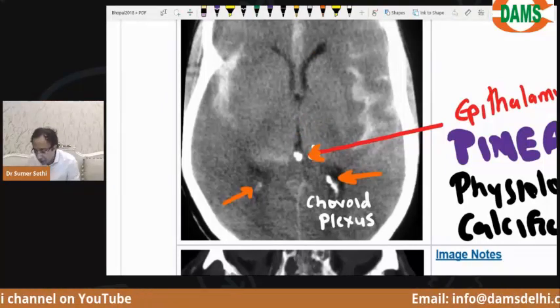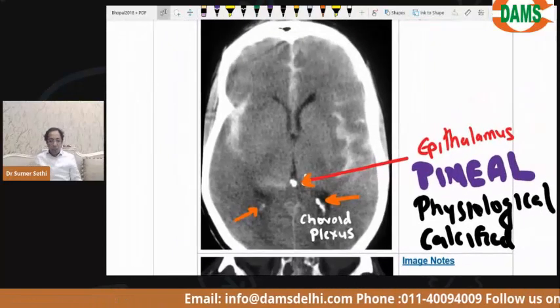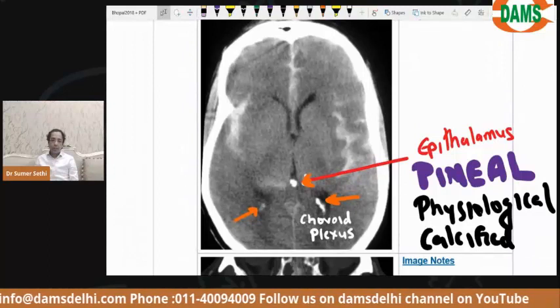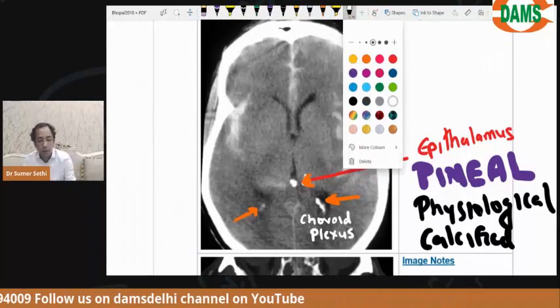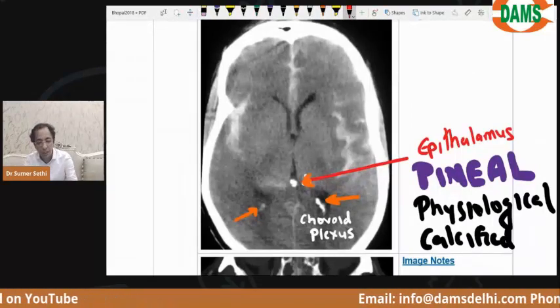Choroid plexus is the one that makes CSF in the ventricle, बेटा. Okay, very good, brilliant. Now, but these are not the disease. This is physiological. Where is the disease located? Disease कहाँ पे?